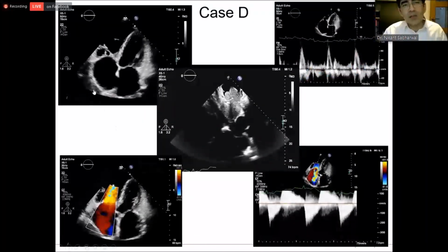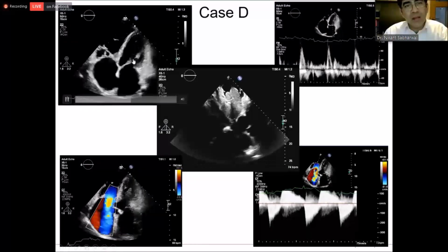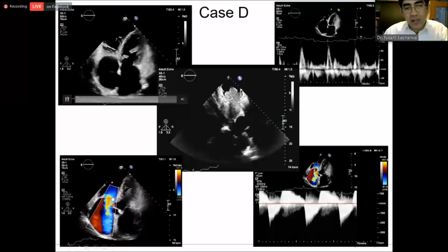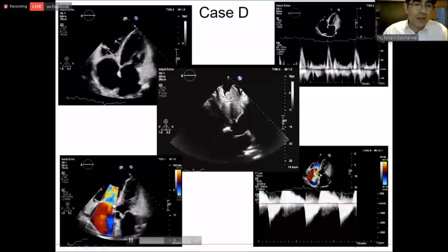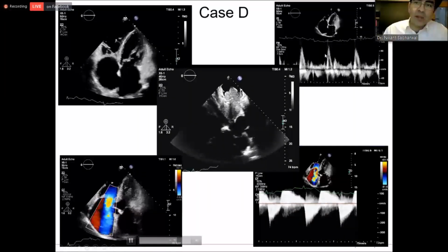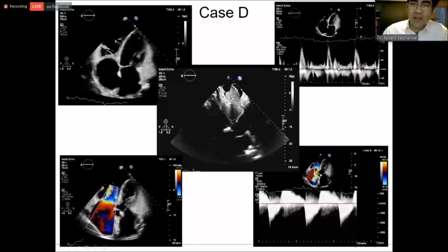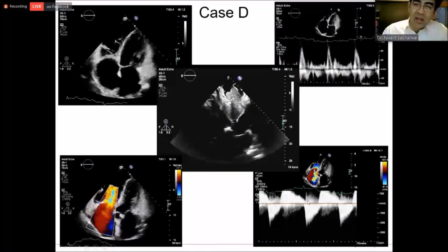When we look at these views, on this modified apical view, the left heart is working very well, big dilated RV, that's straightforward. Again, we get another view of this torrential free flow TR and some TS as well. Her mitral inflow isn't too bad. This lady's in her late 60s, early 70s, so for the UK that's pretty good. And then we see the TR.